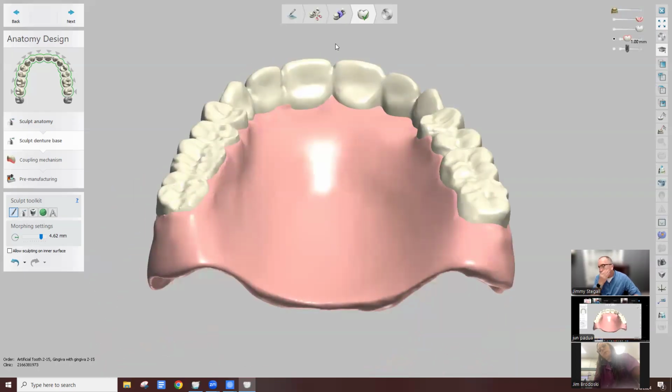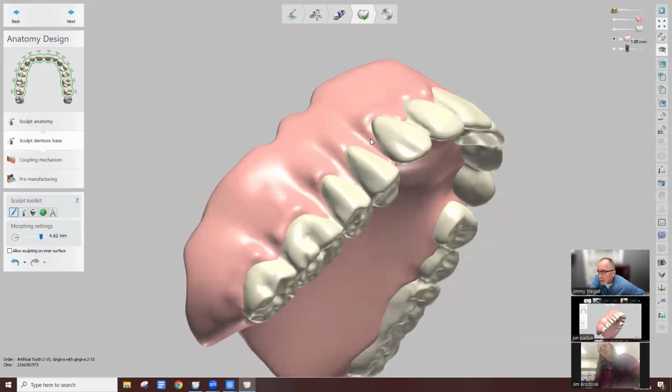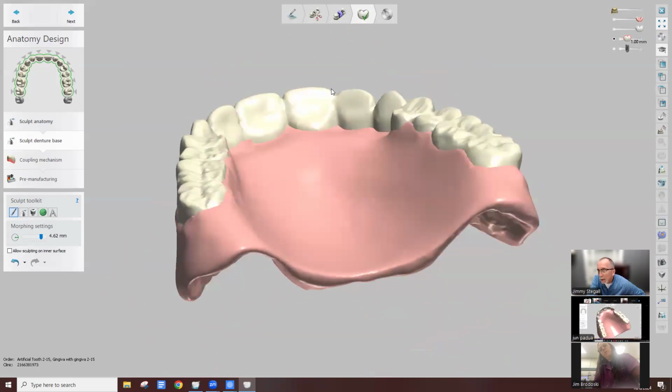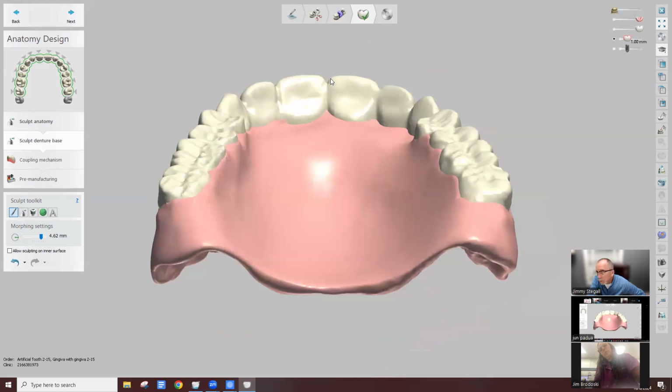All right, so that is pretty much it. Now, had there been impression material, then I would have had to clean that up on that denture model or modification screen. But otherwise, if this is a true copy denture, then I'm done. If it's Lucitone Digital Print, then I still have one other thing to do in this phase, and that's to put those T-bars on there under the attachments.